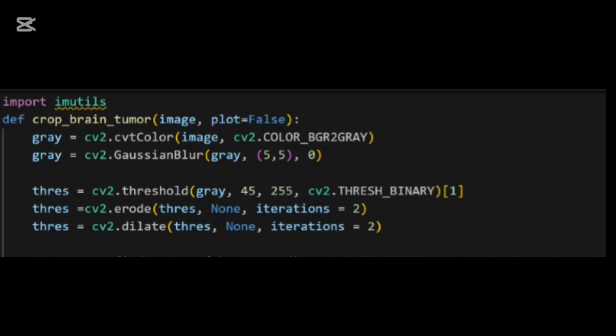So in this function, thresh is basically where we are going to store the threshold image. Here we are passing our grayscale image, our magic number, and the maximum limit, which is 255. It basically converts the blurred image into a binary image. So the threshold value is 45, the maximum value is 255, which is also white. And pixels with values above 45 are turned 255, and pixels with values below 45 are turned 0. Like when I explained earlier, our BGR colors are 120, 200, 80, which are then collectively converted into a grayscale image, giving a number 145.